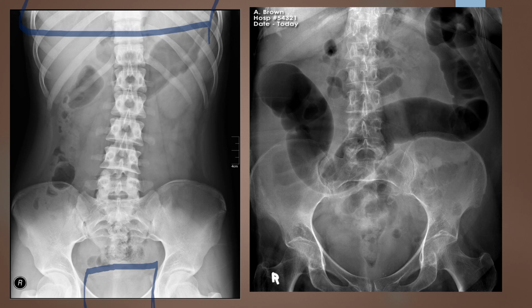So we got some more imaging to do here, but before we do that, let's check everything else and see if we need to correct anything else. So here I see my psoas muscles well. I see outline of the kidney. I see good trabecular pattern here in my ribs. I see the thickest, most densest part of the body has good penetration.